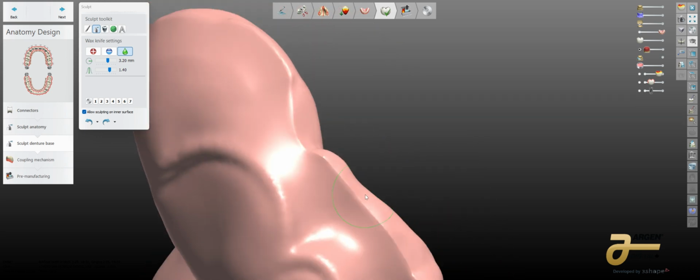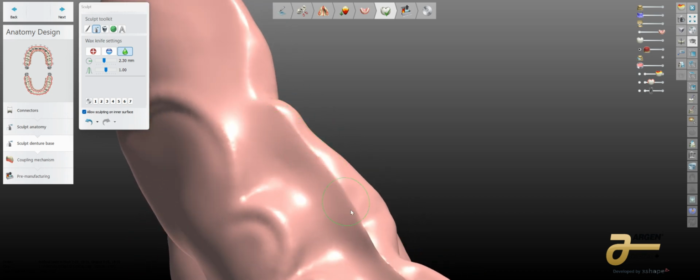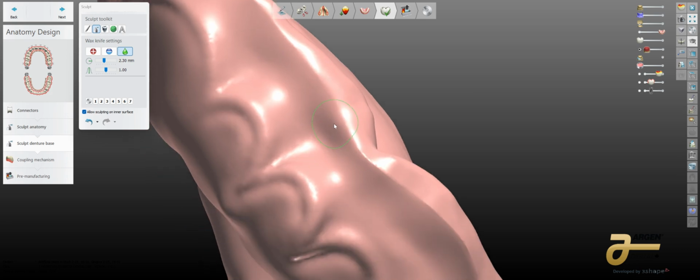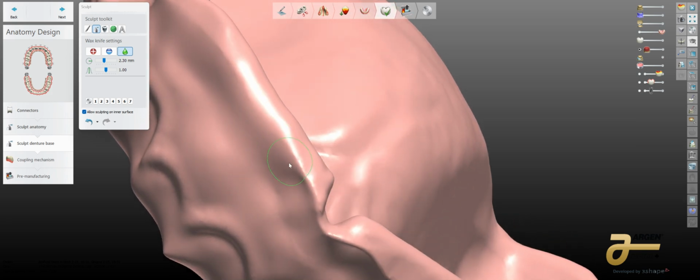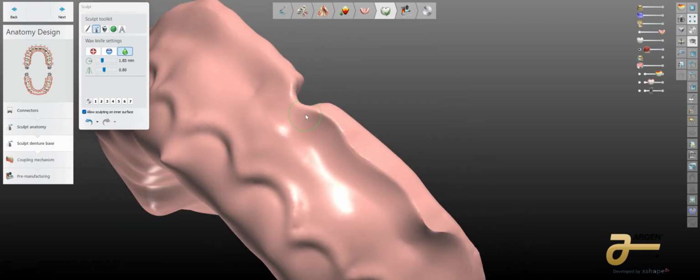So I'm going to come up here rather quickly and easy, and I'm just not going to let the ring go over the corner here, okay? That circle is going to be on that outside edge. And again, I'm not doing anything but just smoothing that transition. The inside peripheral roll is not being altered at this point. I'm just modifying that little ledge that's there, coming around to be able to maintain the precision of the fit of this denture based on how we acquired that data.